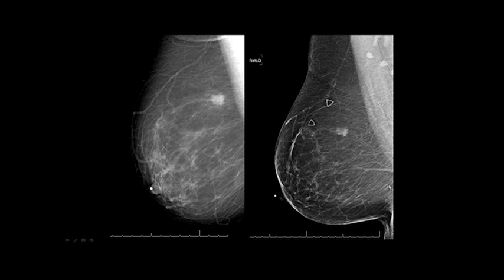You want to make sure to get the fat from the clavicle posteriorly all the way down to the IMF. That's very, very important. That's what they're going to look for. So you can see the quality of positioning. You wouldn't think this would even happen in the United States because of our good equipment, our wonderful education that we have a privilege to be able to learn from.